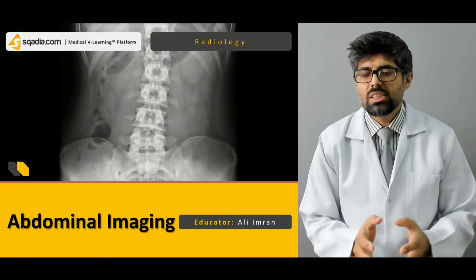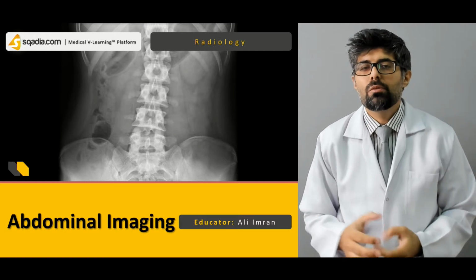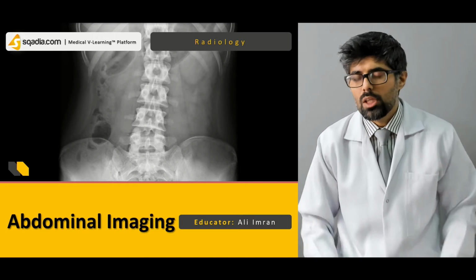Today's topic is about abdominal imaging, that is, the imaging that we use to visualize the human abdomen. So, let's get on with it.